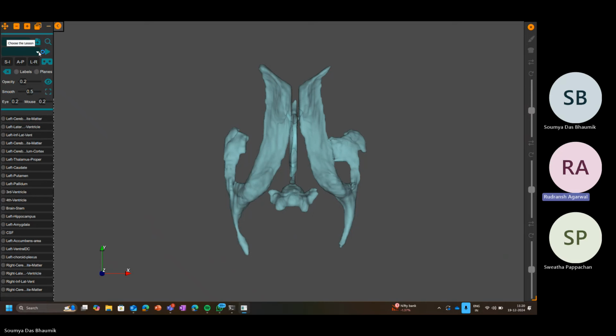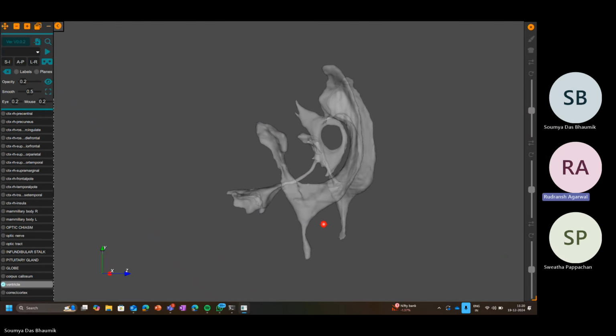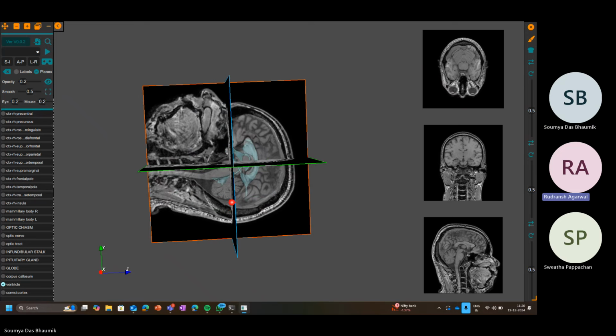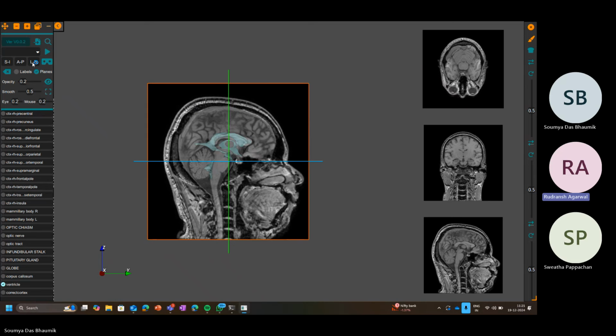So as you can see, if you want, turn the planes off. Yes. The ventricle is a much simpler lesson. It only has one structure in it right now. Although these are different ventricles in themselves, right now it only shows them as a single structure.